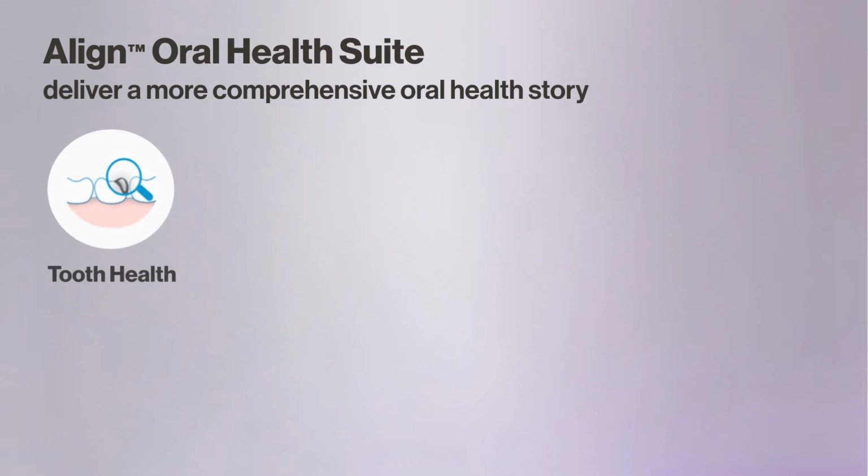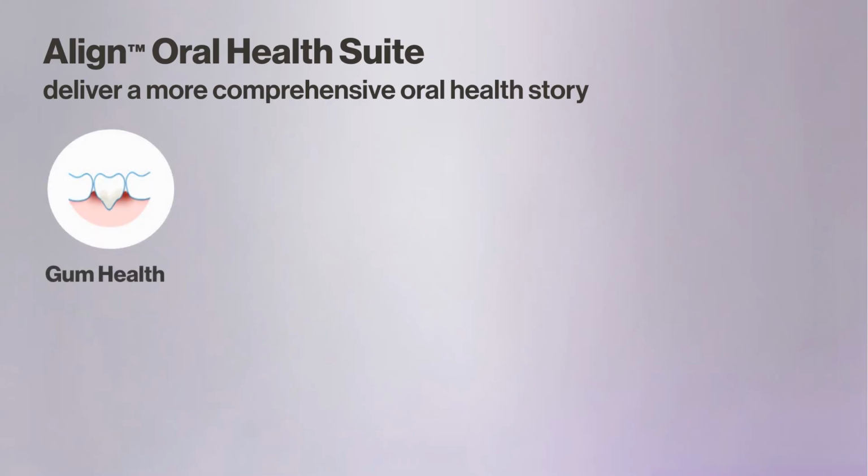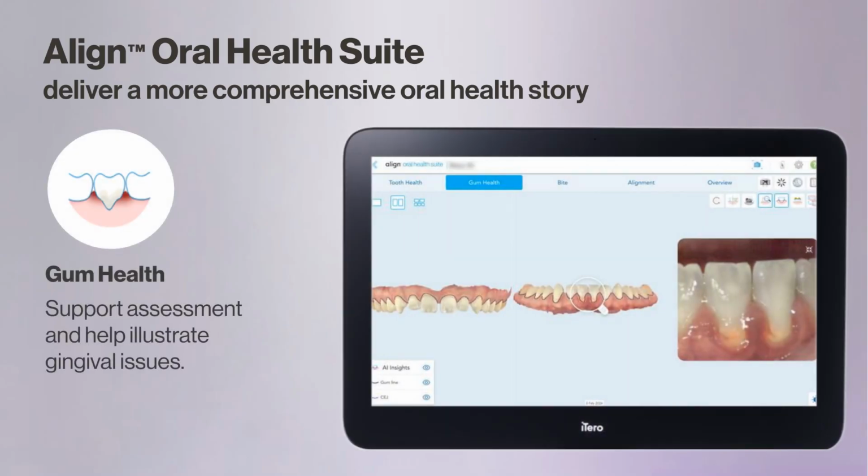First, tooth health. This view aids in detecting interproximal caries and helps assess tooth shape, color, wear, and the state of restorations. Next, gum health. It supports the assessment of gingival conditions and helps illustrate potential gum issues to the patient.